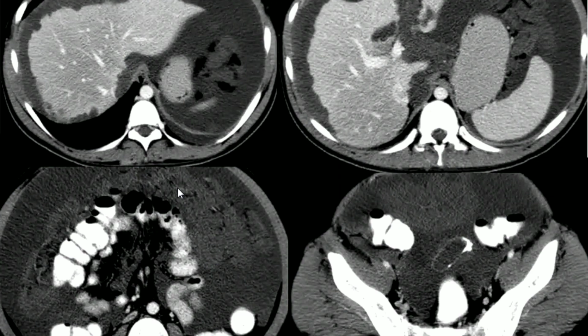Also, we have omental thickening or omental caking. So all these findings mean we are dealing with a neoplastic process and peritoneal metastasis. In particular, mucinous fluid usually results from rupture of a mucinous neoplasm. And this is pseudomyxoma peritonei rather than broadly stating peritoneal carcinomatosis.